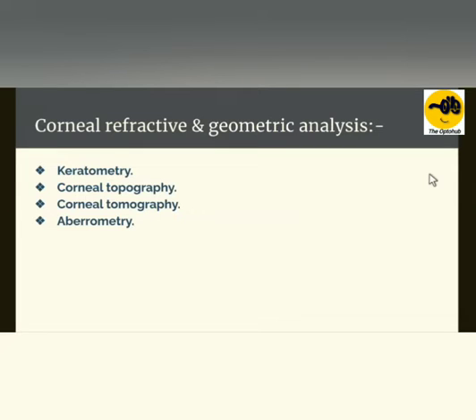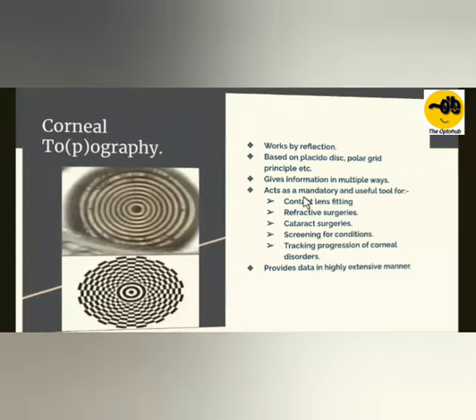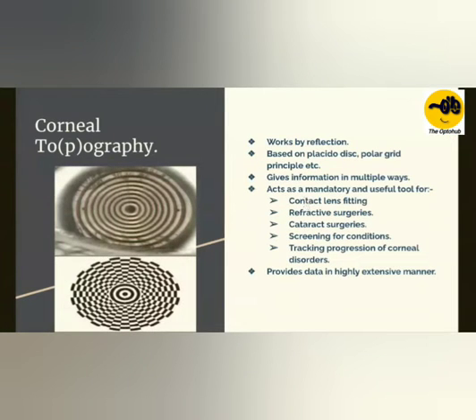So we won't be going in depth about aberrometry or tomography or keratometry. We'll be adherent to corneal topography in today's session. So what is topography? As I told you, it is the analysis of the surface. So this is basically based on reflection.